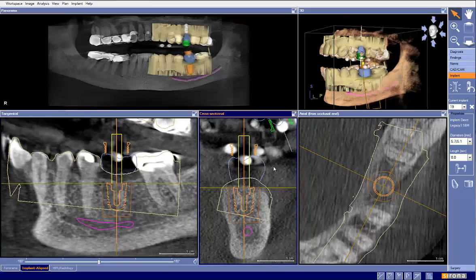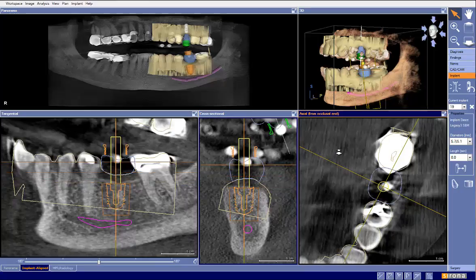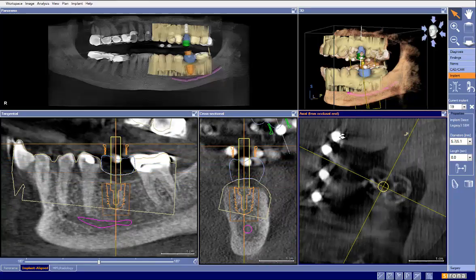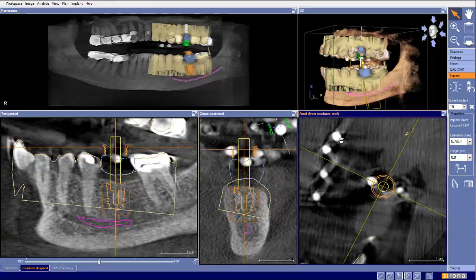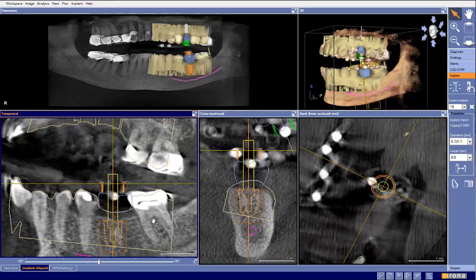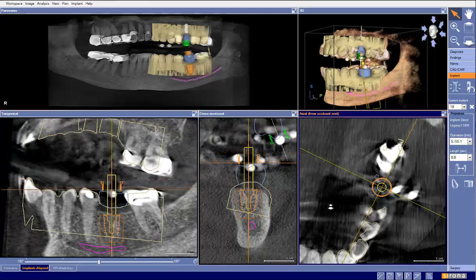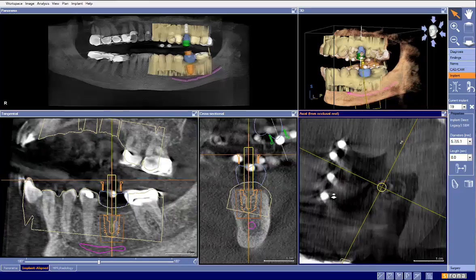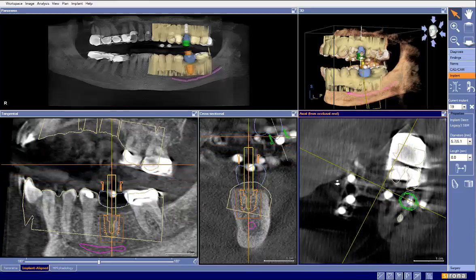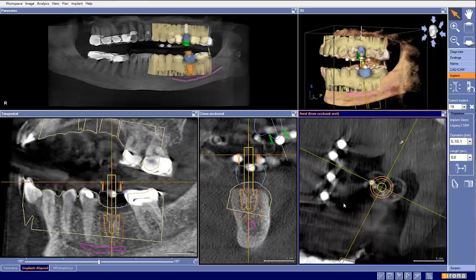The next thing we need to look at is doing the cerec guide and bringing the guide in place. So to do that, we have to register the data. One of the issues with doing multiple implants, multiple cerec guides at the same time, certainly on opposing arches, is knowing which ones are, like, is that T for this one or is that T for this one? I mean, we can know, but we've got to make sure that we don't mess it up.